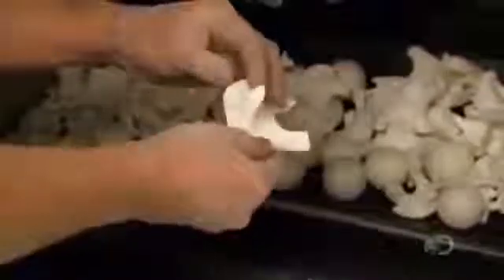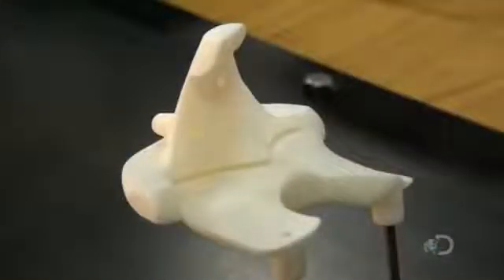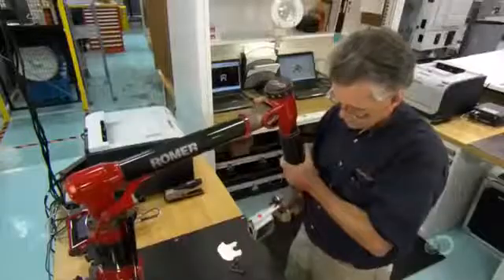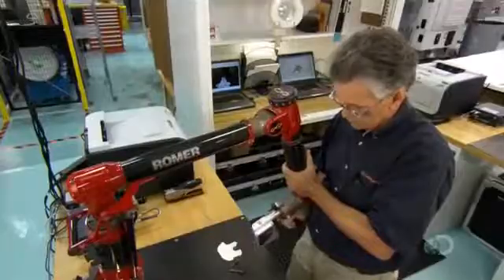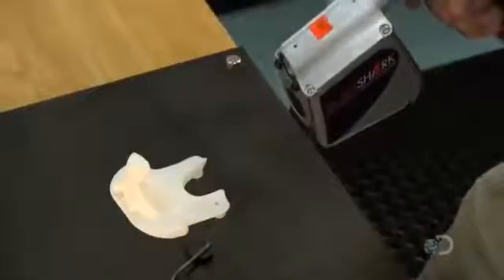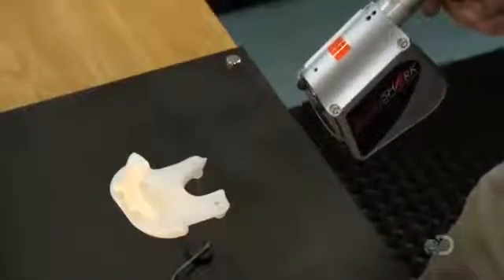They go through 2 wash cycles to remove the last remnants of powder. Before packaging, they'll be sterilized. But first, every template must pass a quality control inspection. Using a laser, a technician scans it to make sure the manufacturing process produced an exact match to the patient's bone, as per the computer model.